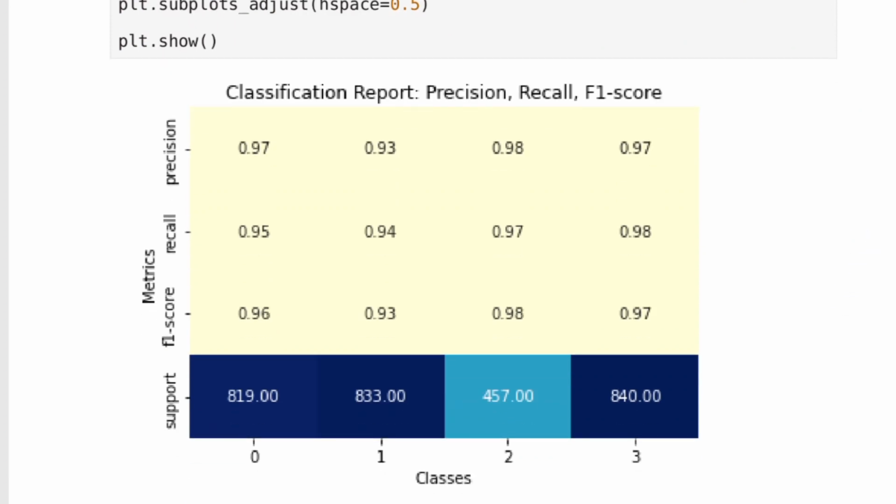And here comes the prediction. So let's move on to making predictions using our trained model. We feed the testing data into the model and obtain predictions by using np.argmax, that is used above in the code. We extract the class with the highest probability as our predicted class. So we also retrieve the true class labels using the same function.